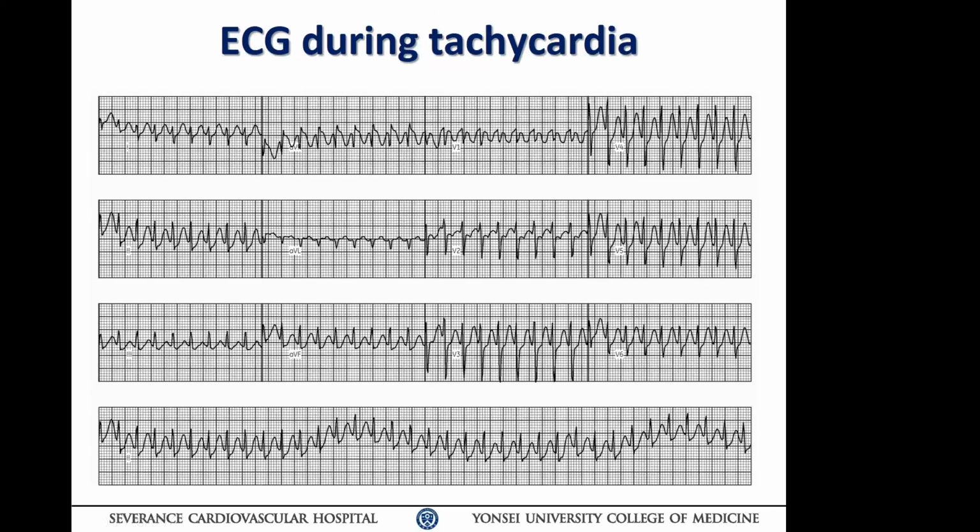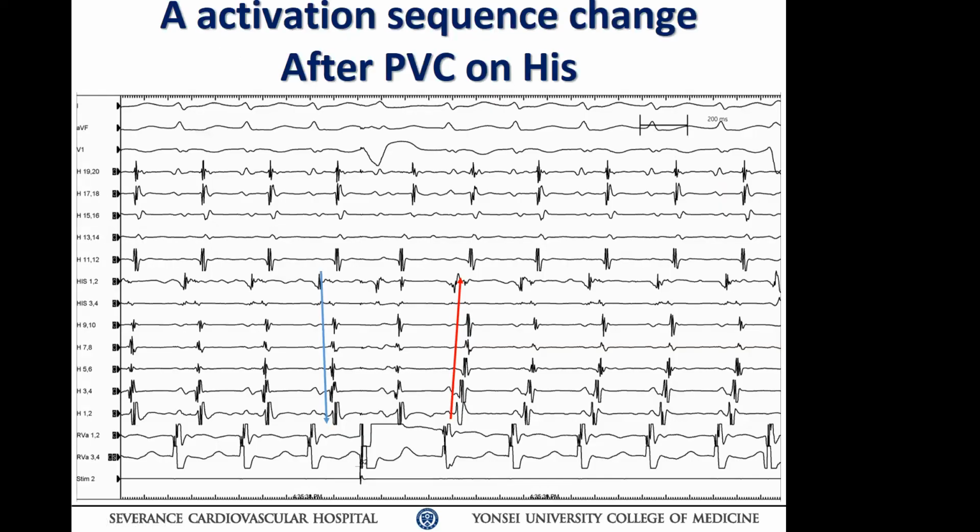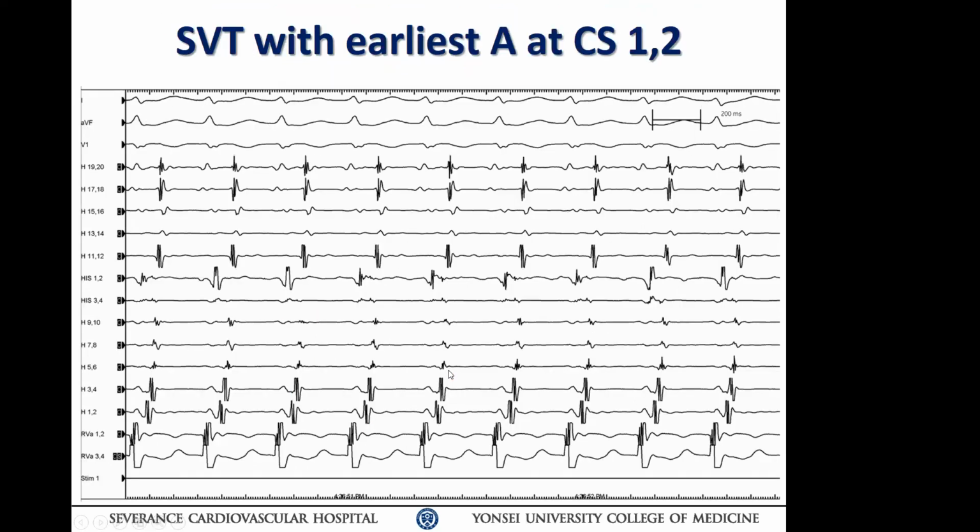This is the ECG during tachycardia. After PVC on His, the sequence of retrograde A activation changed from earliest at HIS12 to the earliest at CS12.